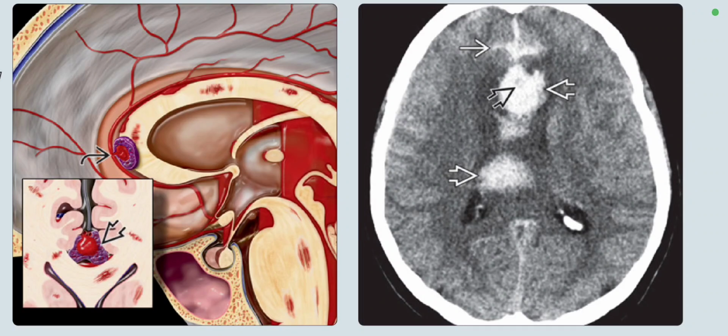So, coming towards pseudoaneurysm cases, left is the sagittal graphic and it shows the sequelae of closed head injury. A pseudoaneurysm of the distal anterior cerebral artery is noted. This lesion is contained by the cavitated clot that communicates with the anterior cerebral artery.